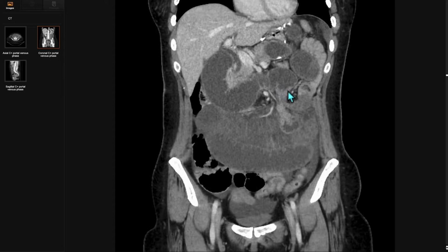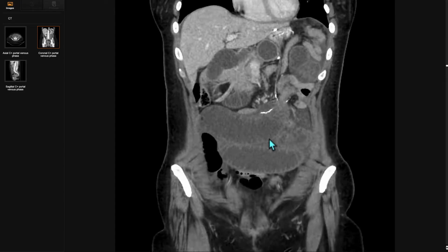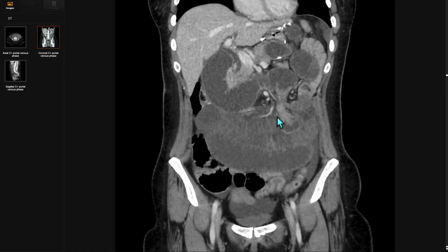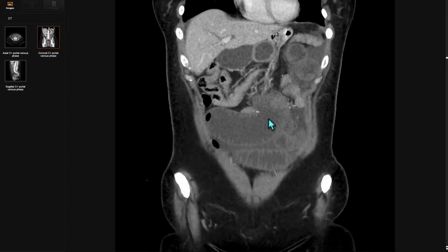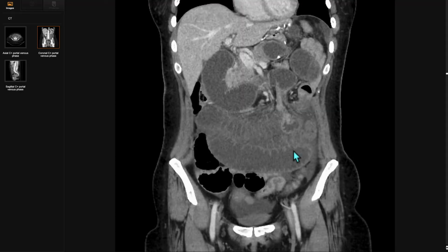and here appears to fall into a defect within the mesentery, resulting in this large cluster of entrapped small bowel that is asymmetrically dilated with mesenteric edema. Here we have an internal hernia causing obstruction of the afferent limb through a mesenteric defect related to the patient's jejunostomy. This required urgent surgery and resection of multiple loops of small bowel.